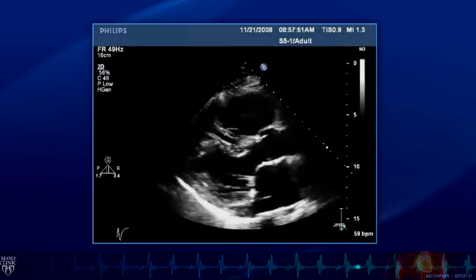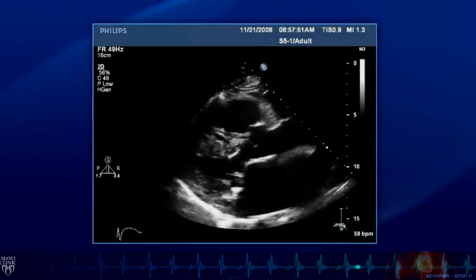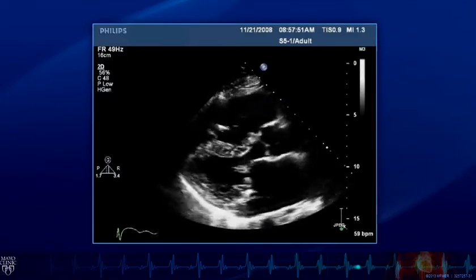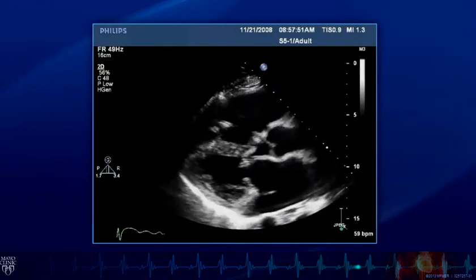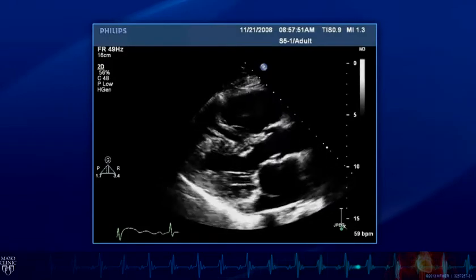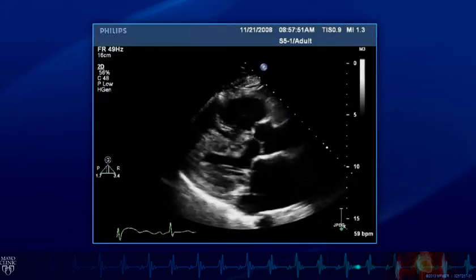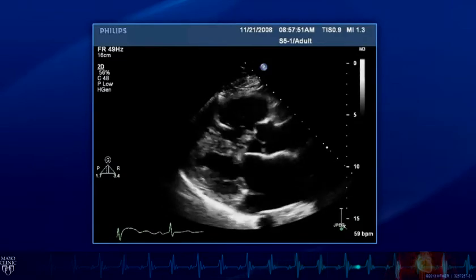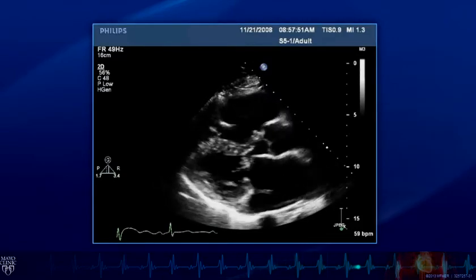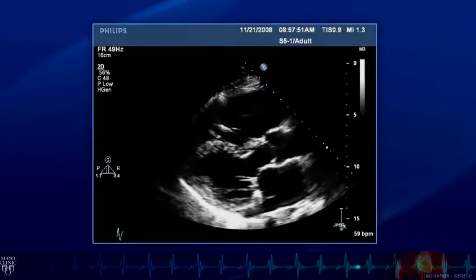The echocardiographic diagnosis should be entertained when we see a large coronary sinus, especially if the coronary sinus appears to be broken instead of a complete ring. So as you look at the parasternal long axis view here, the back wall of the left atrium is usually where we see a small circular structure that is the coronary sinus. Here we see the coronary sinus is definitely enlarged in the left atrium, and the roof is certainly not complete. It appears to be a tissue defect here.